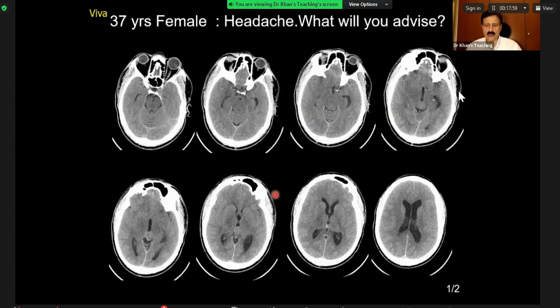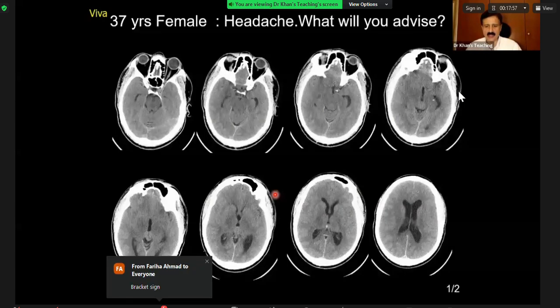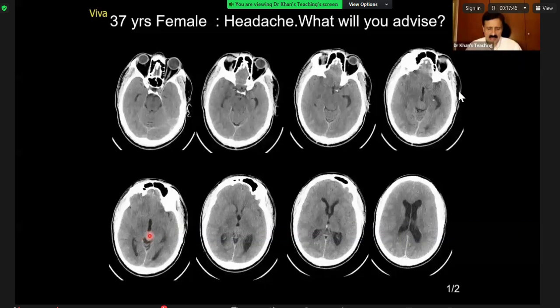Nobody is going to show you a sagittal MR initially. So the key anatomy finding is that look for this slit of the third ventricle, and there will be thalamus here, thalamus here. Posterior to that is the pineal, and if you see something there, then you call it a pineal lesion. So we have picked up a pineal tumor, and we have picked up a bit of hydrocephalus.